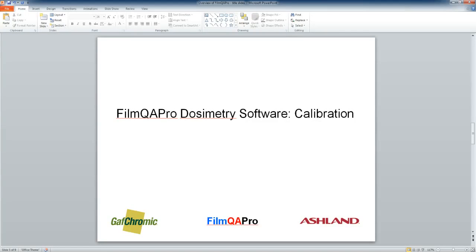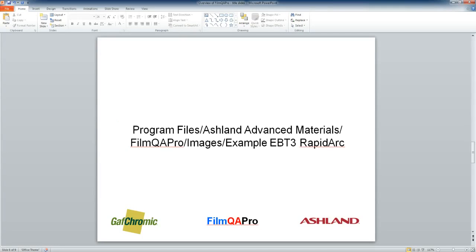This tutorial will show how to use Film QA Pro to do a radiochromic film calibration. You'll be using one of the calibration film images included with the Film QA Pro installation, and you'll find this one in Program Files / Ashland Advanced Materials / Film QA Pro / Image / Example EBT3 Rapid Arc.